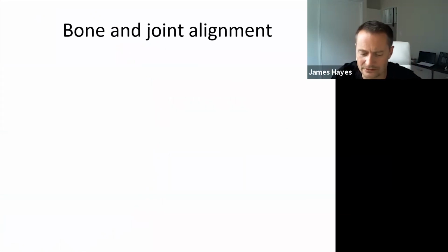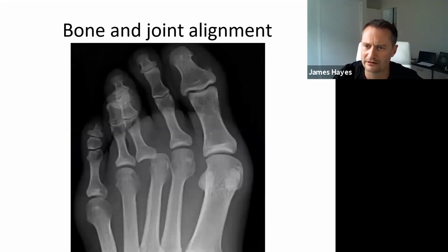So if any one of you, or some of you, may have been to one of my previous talks, a couple of these images will look familiar. And the reason I'm showing them is because they're very good. Now, this is an obvious one.